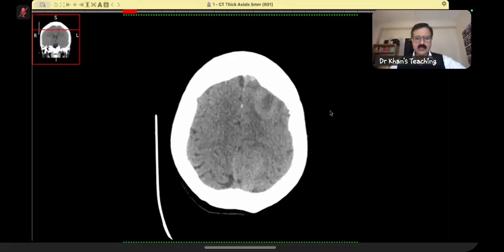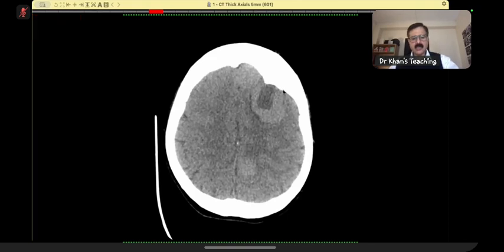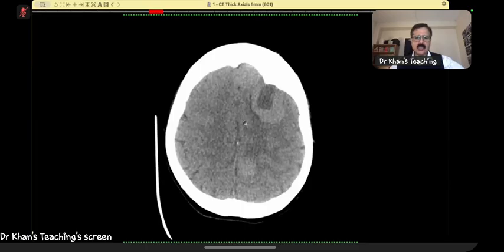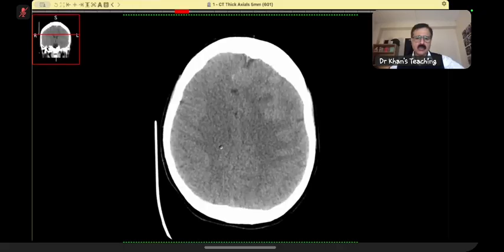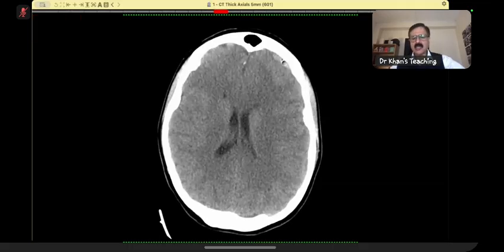Now, in this particular case, we could see these meningiomas which are high density, and one can argue that this one is causing a bit of hyperostosis here, because it is next to it. And then, even on this non-enhanced image, you can develop your eyes to see that there are small lesions on the right side. And if you see here, this is an interesting one. This has come in the exam in another context, so this is a very good teaching point on this case.